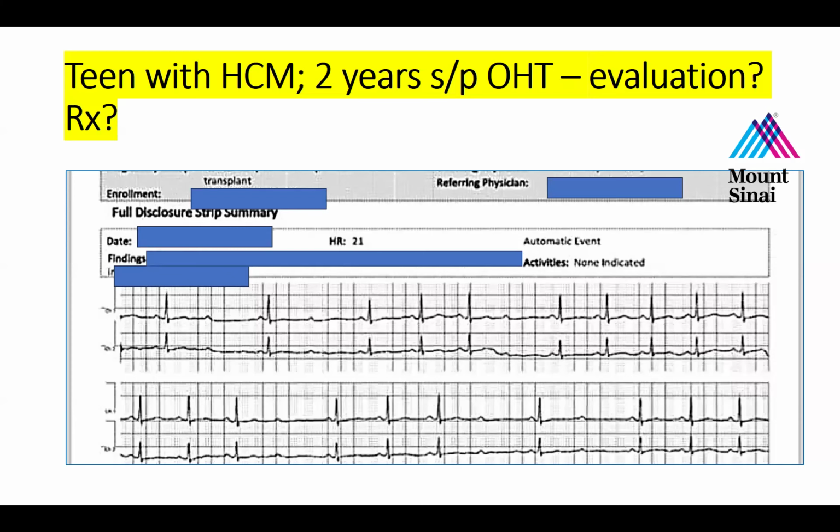Good morning, Dr. Paz. Hello. So the first thing that jumps out at me, looking at these rhythm strips, is that I see P waves without a following QRS. Yep, agree. And then there's a prolonged pause between the R to R cycles in these as well. Right, so that's another way of saying you're seeing some kind of heart block here, right? Yes.